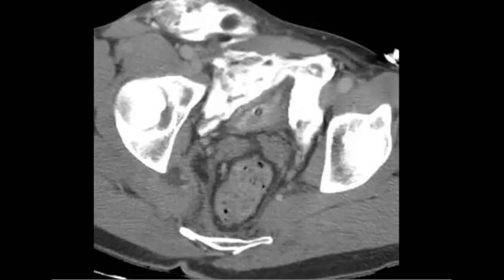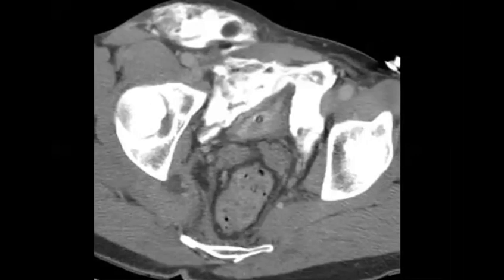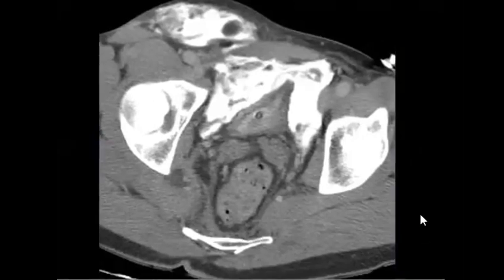So what he described, how he described this, what is happening in this image. I'm trying to focus. So you can see that there is some contrast. So what do you think about this contrast? Is it like a delayed image?